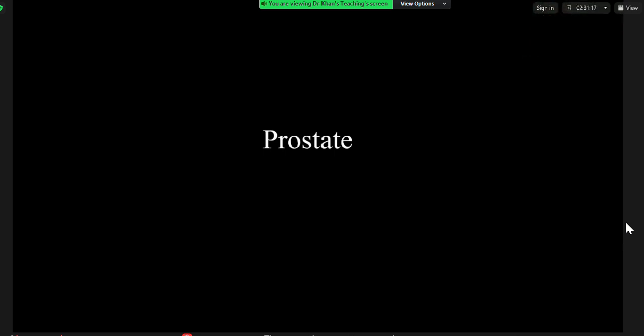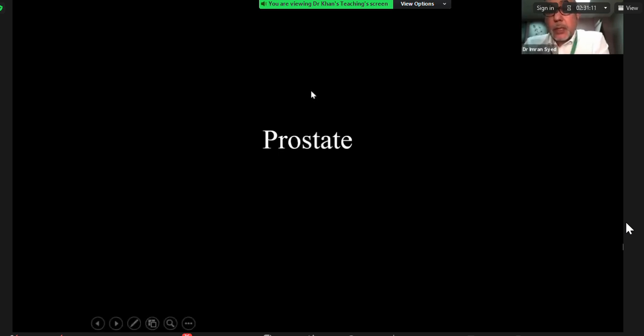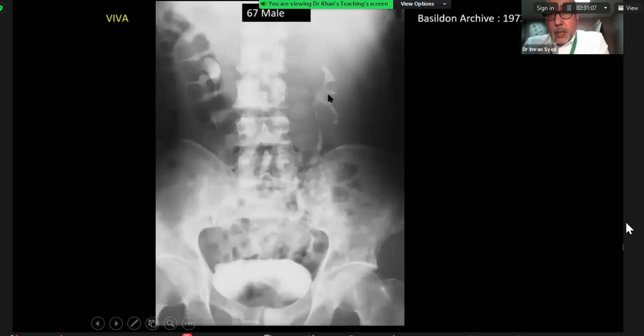Hello. Right, so what we're going to now talk about is we're just going to go through prostates and prostate imaging. But before we do so, I'll show you this film as a Viva film. This is something that's come out of our archives from 1973 from Basildon itself. Can you describe what you see?